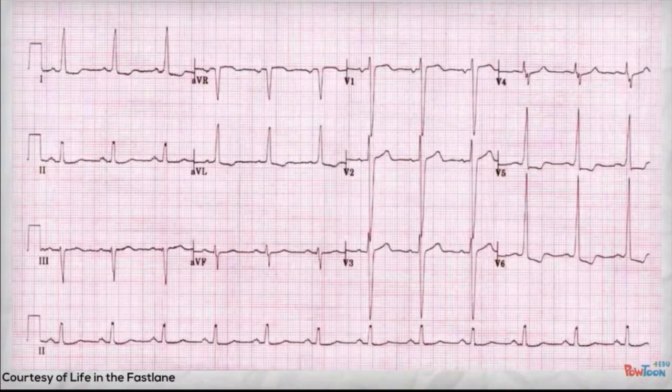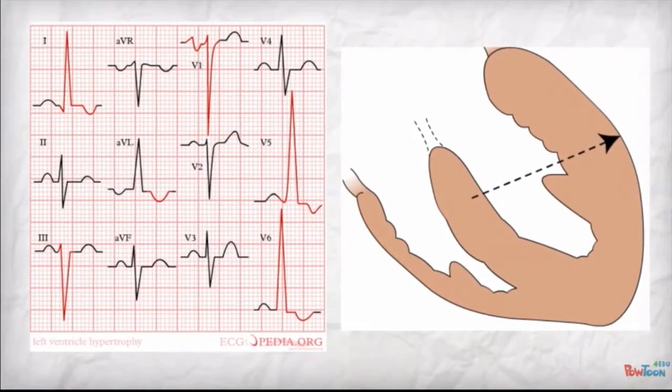Now, here's a 12-lead EKG showing high voltages, concerning for ventricular hypertrophy. Well, what does that mean? Let's look at the leads, particularly for left ventricular hypertrophy. You see lead 1, 3, V1, V5, and V6. There's a lecture later in this course about how to actually determine if it is ventricular hypertrophy.